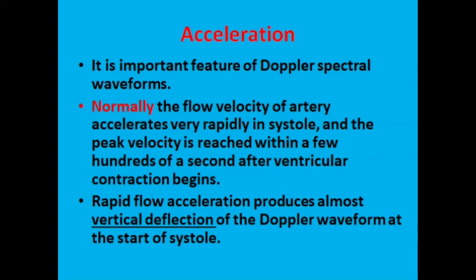Normally, the flow velocity of an artery accelerates very rapidly in systole, and the peak velocity is reached within a few hundredths of a second after ventricular contraction begins. Rapid flow acceleration produces an almost vertical deflection of the Doppler waveform.